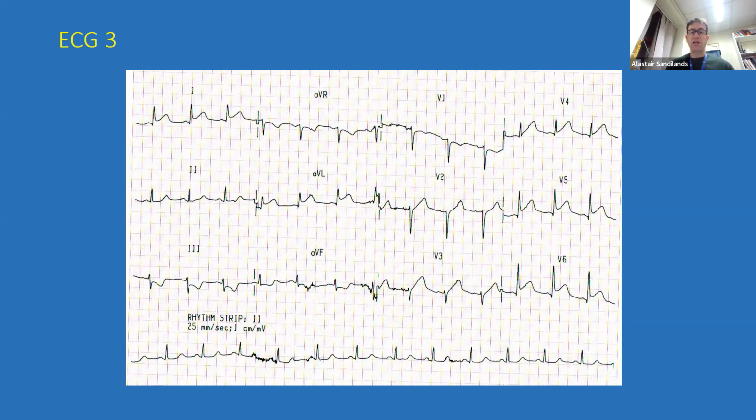So it's a bit more subtle, and it's difficult, you try and accept things. I think these are hyperacute T waves. Again, you've got the benefit of doing another ECG a few minutes later, but you've got enough evidence here to call the STEMI team, because there is a STEMI. I suppose in an exam we might allow a lateral MI, but because V4 is the anterior wall, you've probably got an LAD territory infarct here.